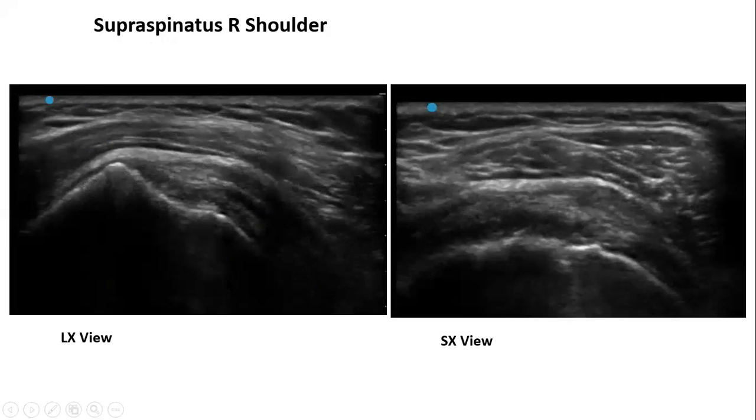So this is again supraspinatus. Now here, this is the case where the tear is not acute, it's chronic. These are the cases that you're seeing, Vicky. So I'm just going to tell you this is a complete one. This is the bursa, which is thickened, and of course, the person who's doing it may not be able to see this in just 2 images. You will have to do some more imaging, some dynamic testing, because this is confusing for a lot of people.